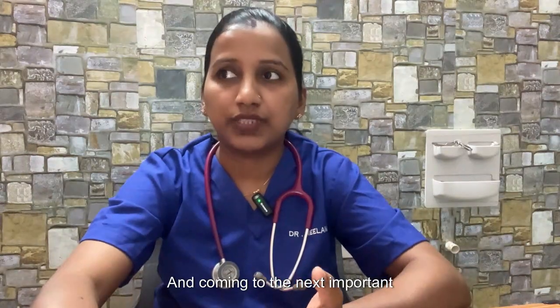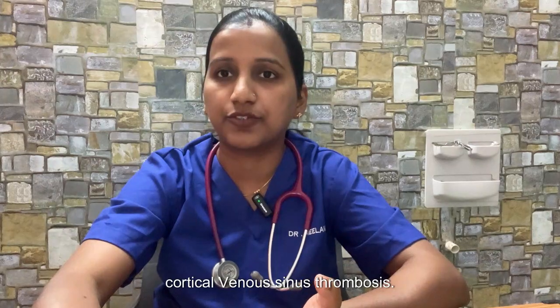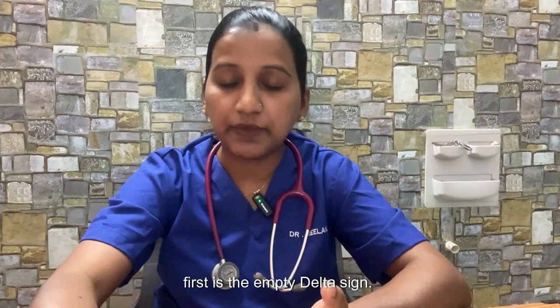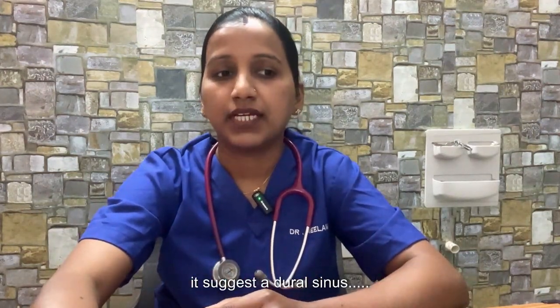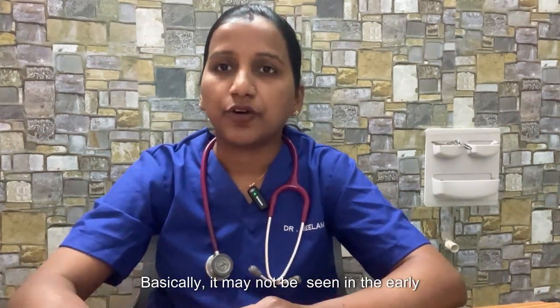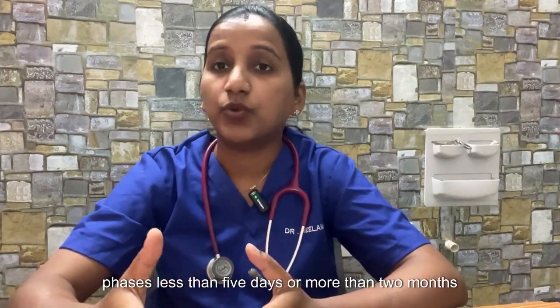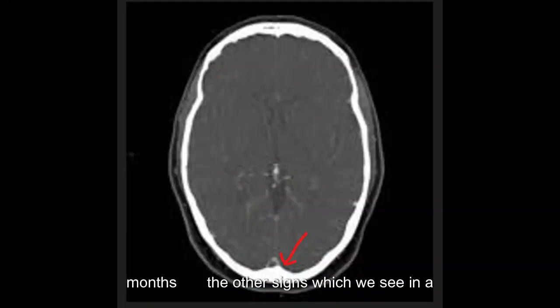And coming to the next important presentation to emergency, that is cortical venous sinus thrombosis. So what are the signs we generally see? First is the empty delta sign. It is seen in a contrast enhanced CT scan. It suggests a dural venous sinus thrombosis. It is seen in 25 to 30% of cases basically. It may not be seen in the early phases, less than 5 days, or in the later phase, that is more than 2 months.